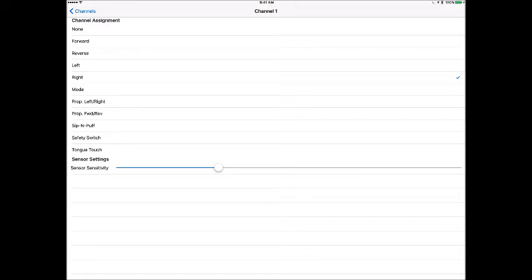where the direction is programmed. But you can see here that there are other features that I could change. So we're just going to go through some of them. One of the things that I can do is turn it off here too. If I don't want somebody to have access to it, and I'm just working with them on a couple of directions, I can come in here and turn off some of the directions.